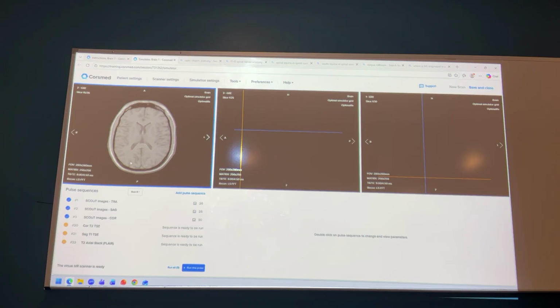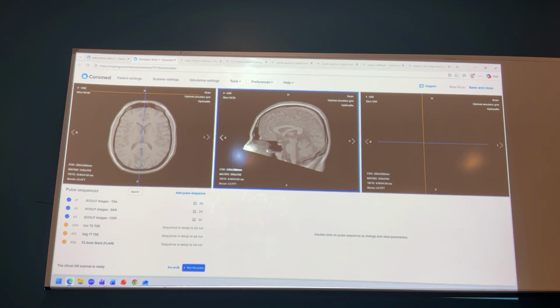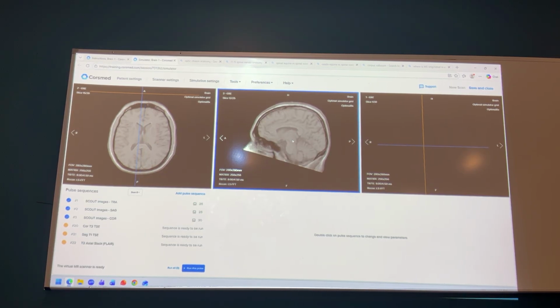And then also you have to know your planes. This is axial plane. Now this one, what is this one? Term 3, what is this one? Sagittal. Sagittal, yes. So a good image on sagittal would be slice number 13, because I want to see this guy right here, which is called the thalamus. That's where you want to center your slices on. Okay, so the thalamus here. In number 12 or number 14, you can't see it. You gotta be on number 13.